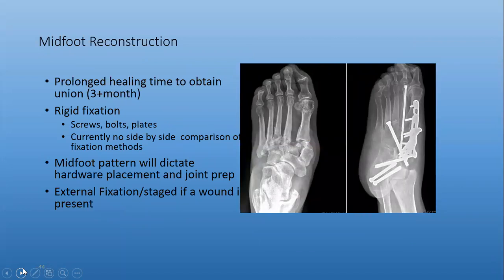So I'd like someone to read this X-ray. This is a really good pre-reconstruction X-ray. So if someone wants to take this, just for the post-reduction and post-fusion, it's a very rigid construct. There's plates and screws and bolts.